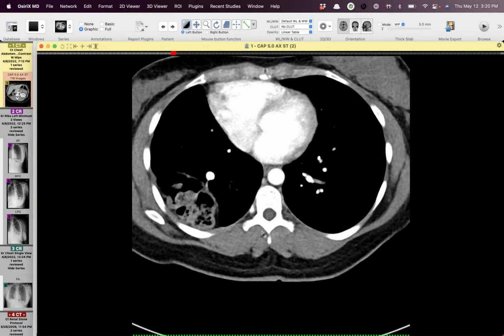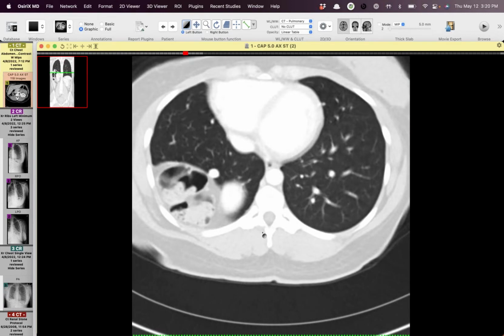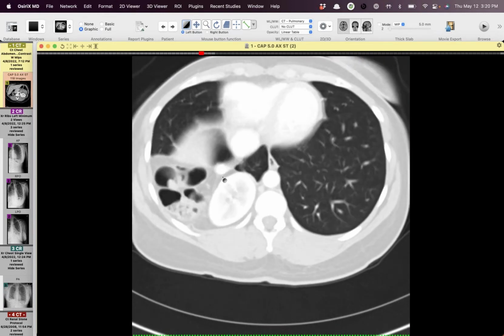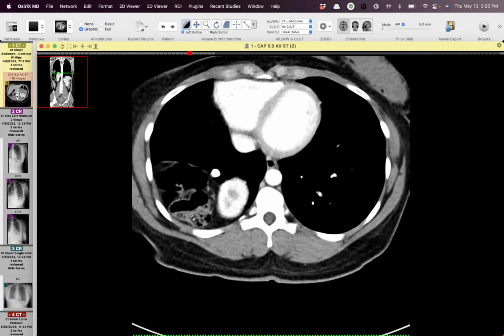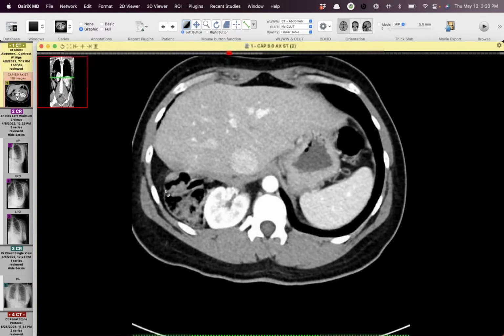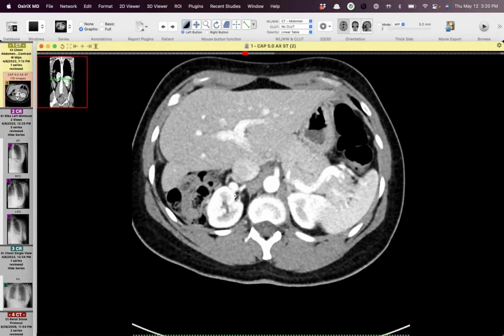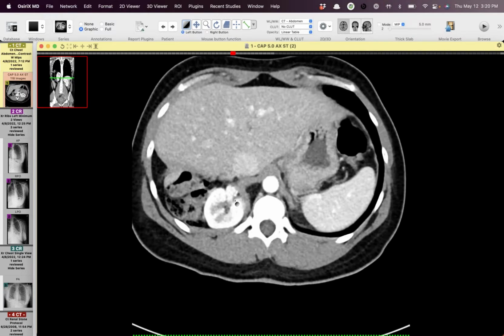I know we've seen a case, and I think David or Jeff, one of you mentioned the idea of the double diaphragm or duplicated diaphragm in the setting of scimitar. So here's the scimitar vein. And this is not just an acute traumatic diaphragmatic hernia, but I don't know if there is diaphragm above this, or if, I don't remember if we've seen in our other cases, this just happens to be a huge Bochdalek type hernia associated with the scimitar, or what?